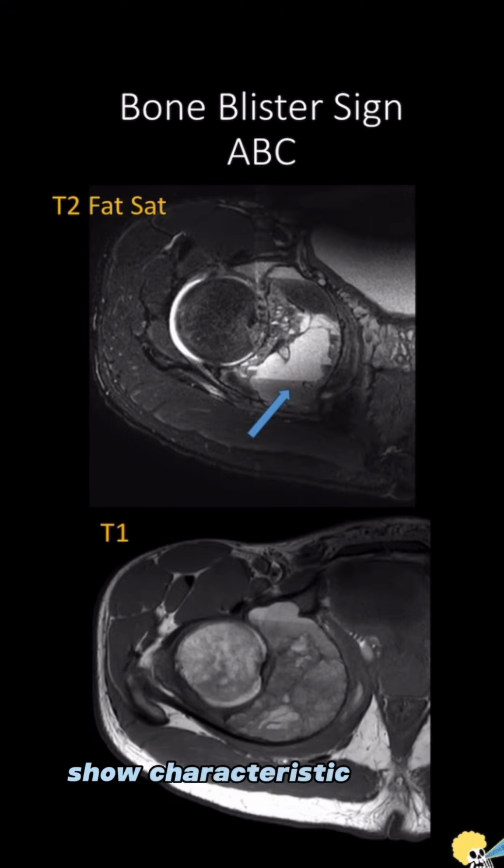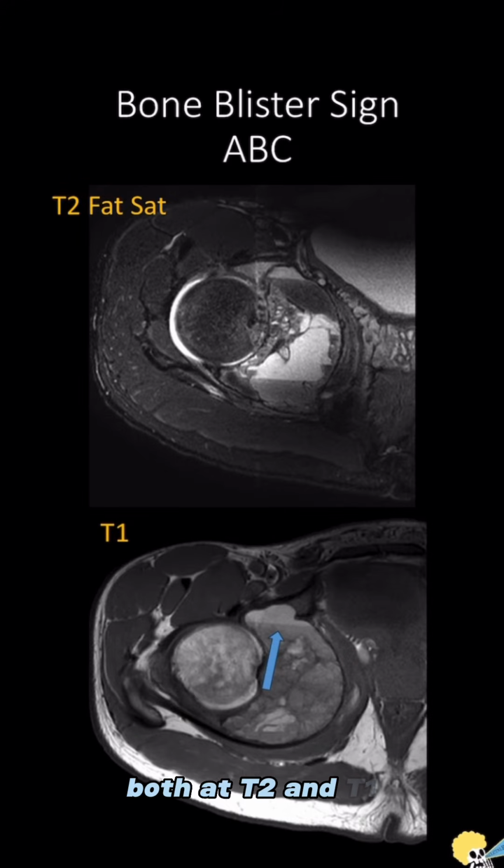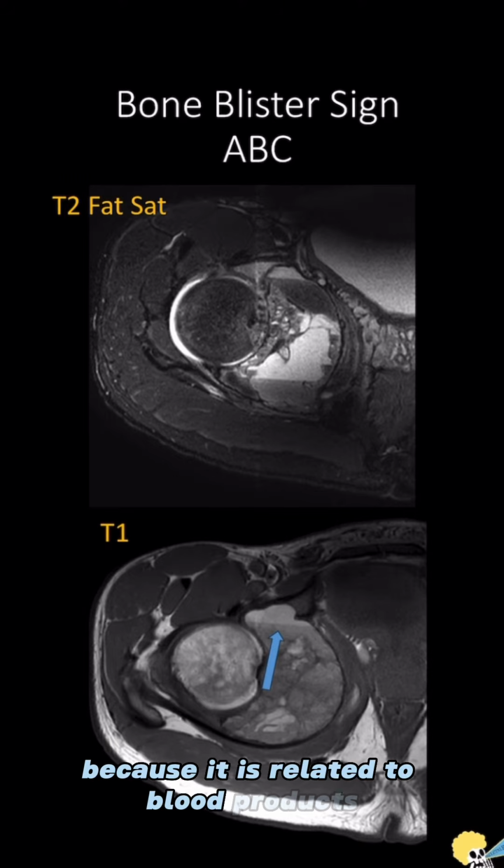So aneurysmal bone cysts in MRI show characteristic fluid levels both on T2 and T1 weighted images. We see different signal intensities both at T2 and T1 at these fluid levels because it is related to blood products in different stages of decomposition.